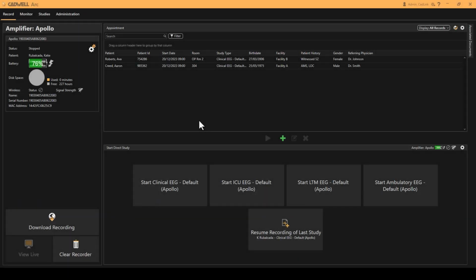In this video, we will review the functionality of the Studies tab in ARC 3.2. To navigate to the Studies window, click on the Studies tab located near the top of ARC.